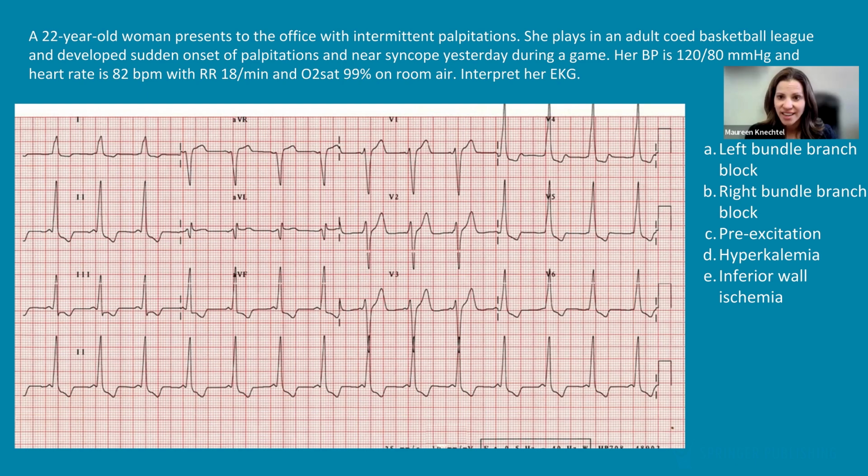And that's essentially what the sinus node does. When there's electrical activation, it's spreading through the atria and it's going to make its way down to the AV node. You see that on EKG as a PR interval. Okay, so if you've got an accessory pathway, so that's occurring outside of the AV node, as that electricity ripples through the atria, it might get to that accessory pathway faster than it gets to the AV node. And so that's what we call pre-excitation. So we have a PR interval that's short.